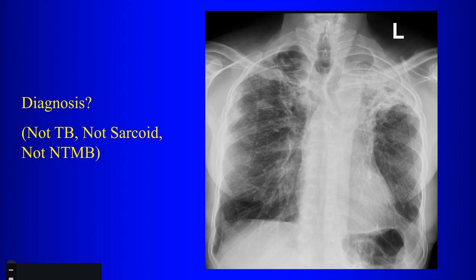The distribution of disease is bilateral upper lobe. So you have a disease here that is causing bilateral upper lobe scarring and fibrotic changes. Of course, TB would be your first thought. Sarcoid might be your second thought. Atypical mycobacterial infection might be your third thought. What's left? Oh, hypersensitivity. Not a bad idea, although it usually doesn't cause this extensive change, but certainly you might consider that.